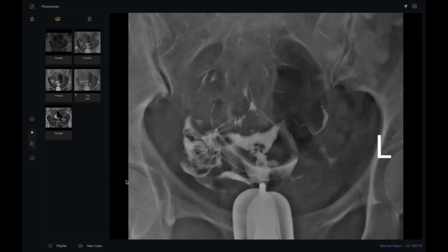Yes, this is adhesion due to Asherman syndrome, caused by extensive or aggressive curettage of the uterus. There are filling defects due to the synechiae or adhesions, and there is irregularity. Besides that, there is blockage of the left tube. Thank you, doctor, so much.